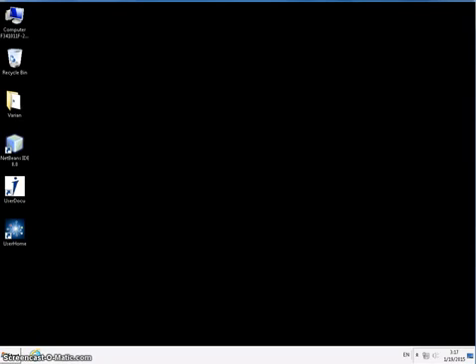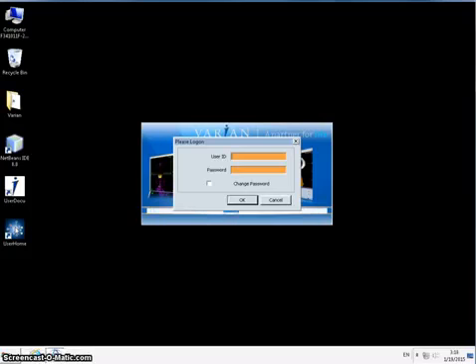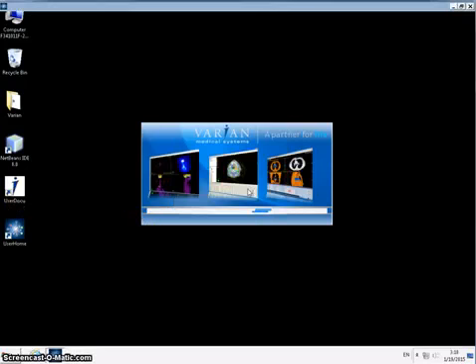So you should hopefully be logged into your PC by this point, and to launch Eclipse we need to double click on this user home icon. And then the username and password for the Eclipse station depends on which station you're sat on. So you'll have a number in front of you. So say I was sat in front of Eclipse number 2, I type Eclipse 2 there, and then I shall let you know the password on the day. And we'll click OK.